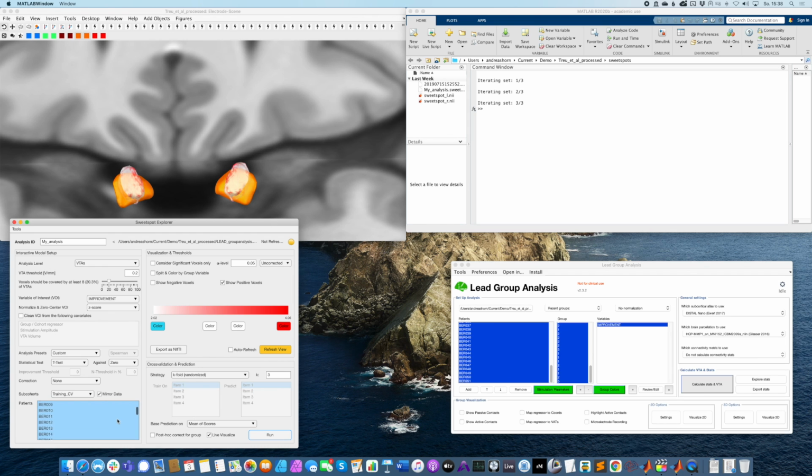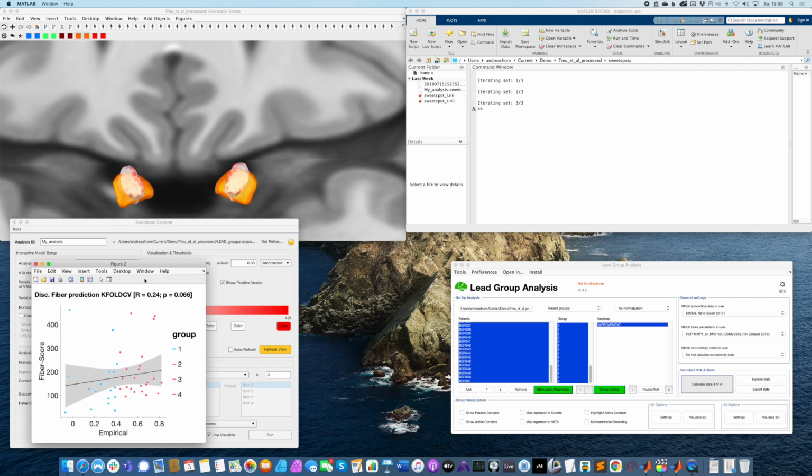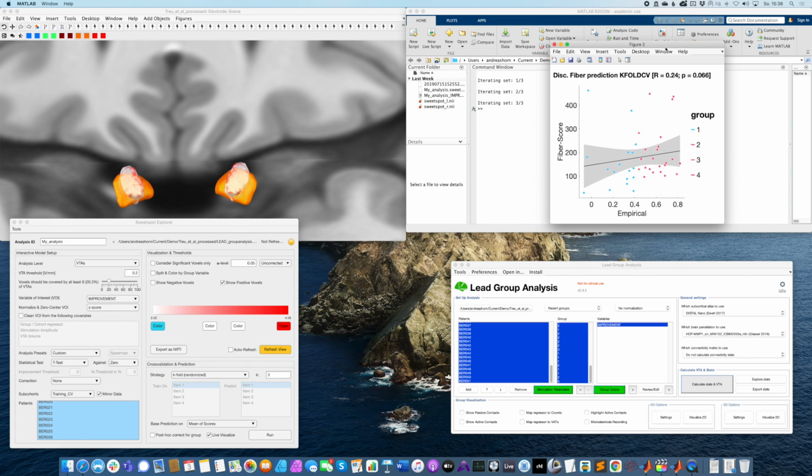And remember, we are doing this currently only in the training and cross-validation set. So in terms of the machine learning concept, we could also label this process as the model selection process, right?